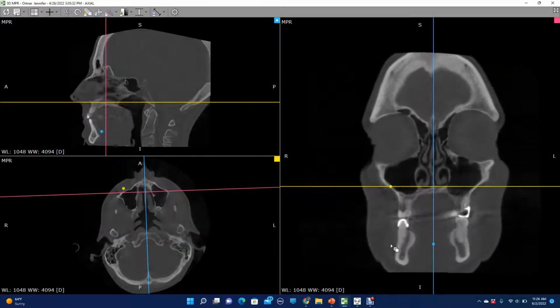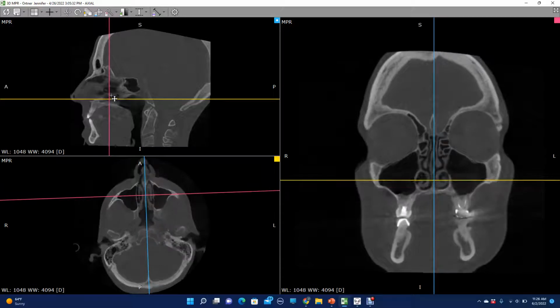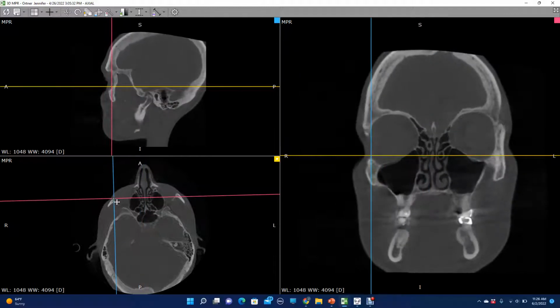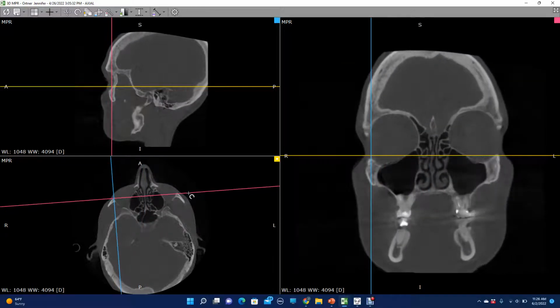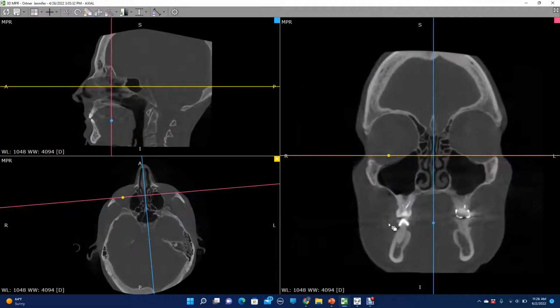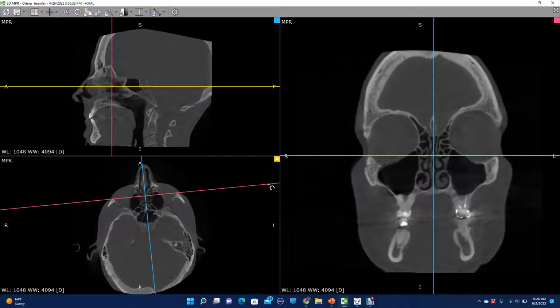And so as I roll, I'm looking to see, do my orbits close symmetrically? And they don't, because if I come up here and check the orbit, I'm only on this part right here, but I'm not on the other side. So let's align this to the orbits. And now, as I roll through my frontal, my orbits should close together better. Try to get it perfect. Wrong direction.